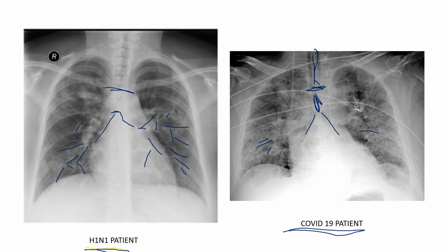Like I said, if you can't see the carina right now, that's something that takes time to develop. Reading an x-ray, ultimately, when it comes down to it, takes time and patience. And the more you do it, the better you'll get at it. So don't ever stop looking at it. When you see a physician looking at an x-ray, when you see someone looking at an x-ray, take time. Tell me what you're seeing, right? Go up to them, show me what you're looking at, show me what you're seeing. How do you go about it?